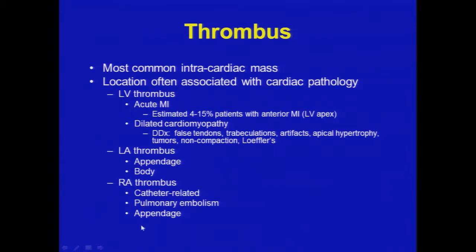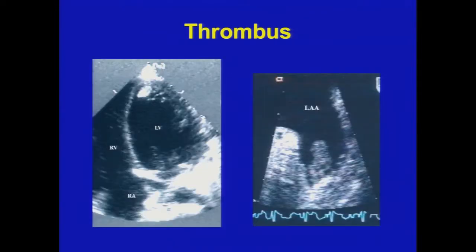I'll show you another example, and rarely within the right atrial appendage, much less common than seen in the left atrial appendage among patients with atrial arrhythmias. Here are just a couple of still frames.